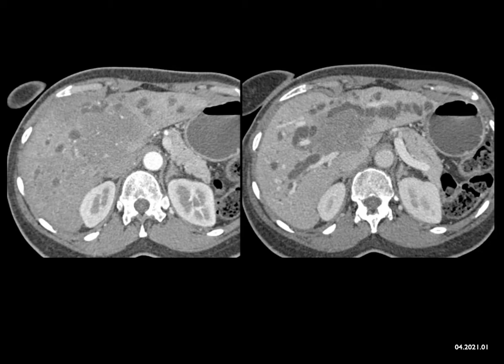It is possible that this could be lymphoma. Lymphoma is one of those things that can infiltrate the hilum of the liver and cause duct dilatation. Carcinoid tumors can involve the hilum, but usually they're vascular. You get some sort of abnormal vascularity, and usually you'll see a tumor away from the liver as well.